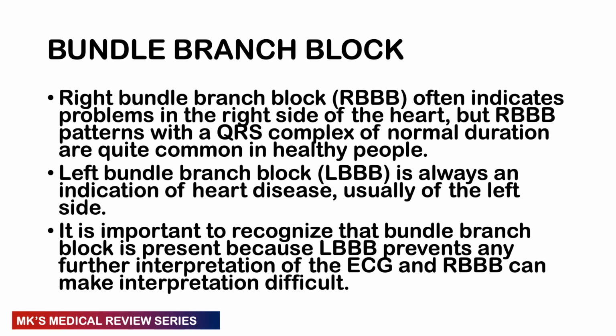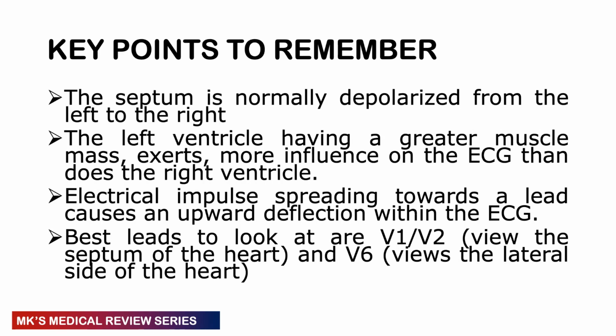Right bundle branch block could be normal in some patients, but it could also indicate that there is some disease on the right side of the heart. But left bundle branch block, almost always there is a problem with the heart. So it's important to recognize these bundle branch blocks, because remember that if you have a left bundle branch block, you're not going to be able to interpret your ECG any further. If you have a right bundle branch block, it may make your interpretation of your ECG a bit difficult. So you should pick these up when you're interpreting your ECG.